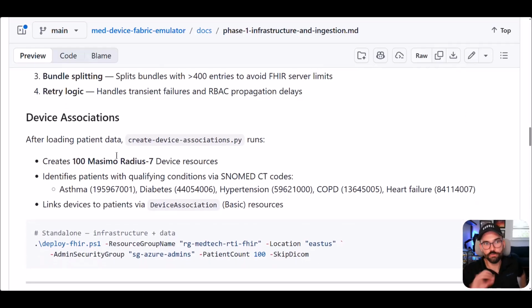And crucially, Synthea doesn't necessarily tie synthetic patients to the synthetic PPG monitors that we're using for Masimo. They don't know about each other. So there's a tiny little Python script that marries those two things together to say patient John Smith, that is fake, and Masimo device 0001 are now associated with each other. So for all of my metrics, John Smith has a fictitious oxygen saturation drop below 80, which is a critical event. Tying that together is very critical.